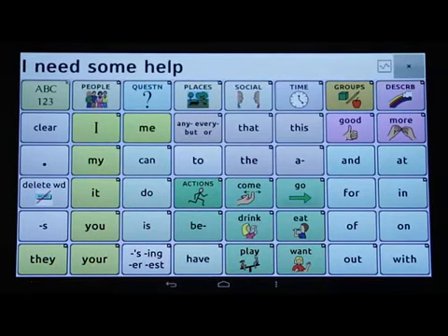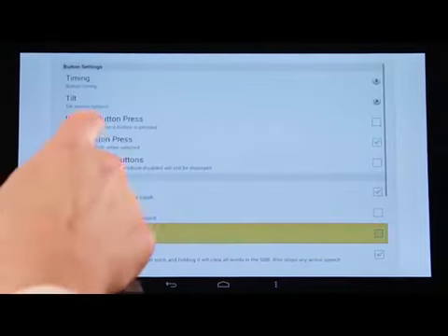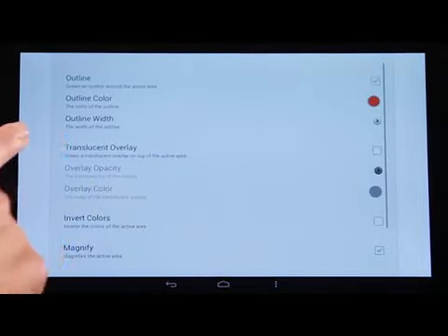Another visual option available is Animate Effects. This will animate the active visual effect. This example will use WordPower 48 with a block pattern.